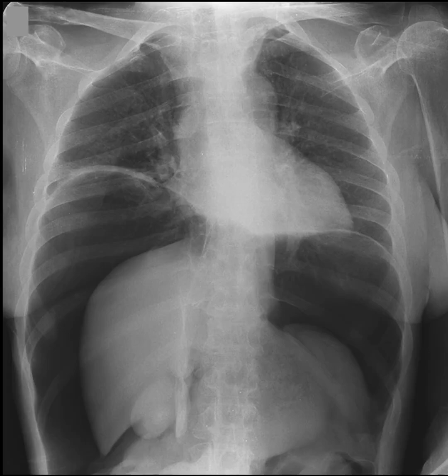What should be jumping right out off the screen at you is all this black on both sides here. Remember, black on x-ray is air. So there's all this excess air here that doesn't belong. Now the question is, what's the diagnosis? A lot of you guys said bilateral tension pneumothorax. And while that can happen, these are not pneumothoraces.